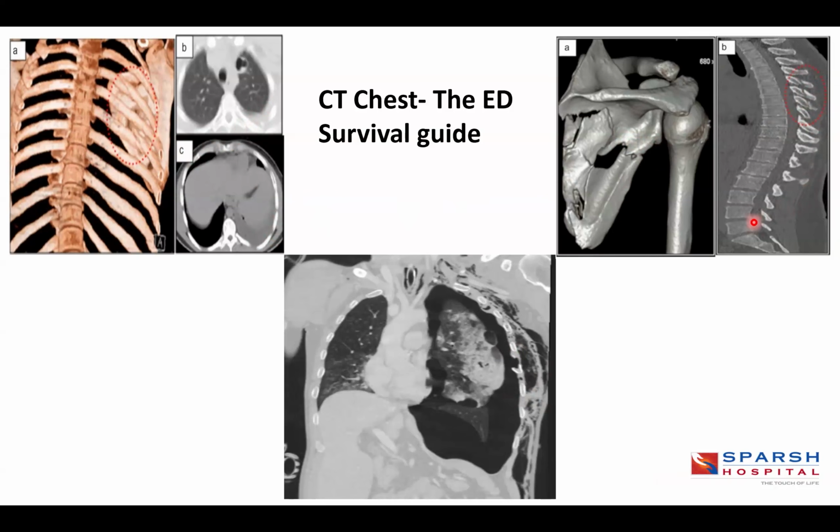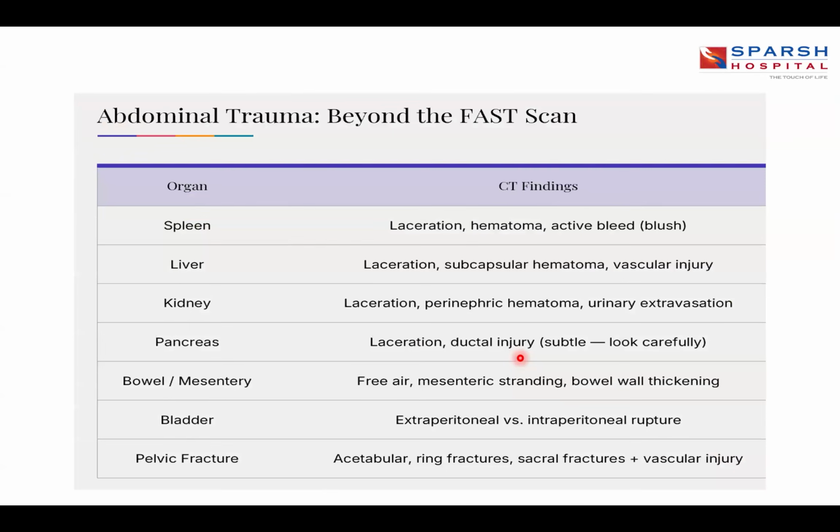As we saw in the last class by Dr. Aparijita, it can be very important. It can be life-threatening, and it can make the patient suffer for a long time in the coming days. And in the chest CTs, this is a scan with multiple findings. You have rib fractures, you have a pneumothorax, you have subcutaneous emphysema. All in all, a good CT thorax series.